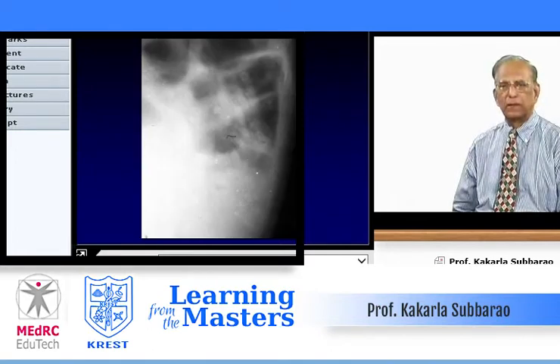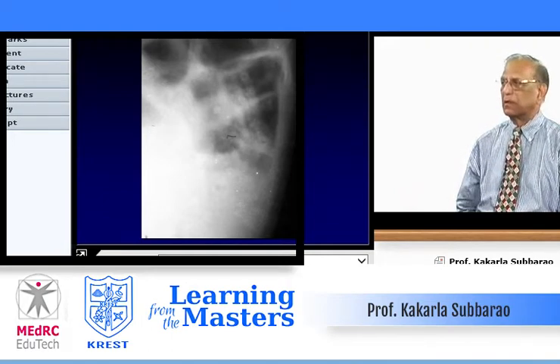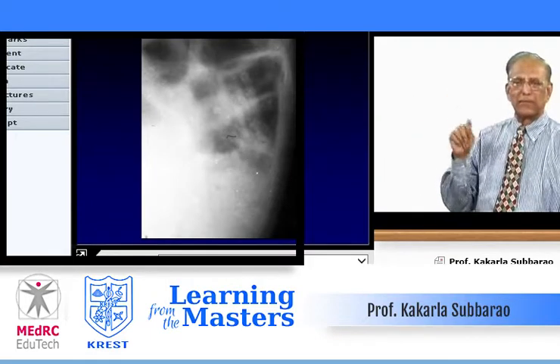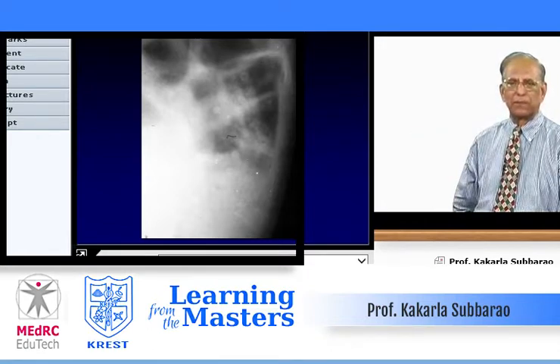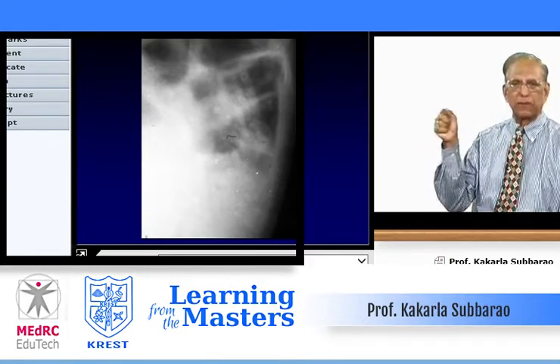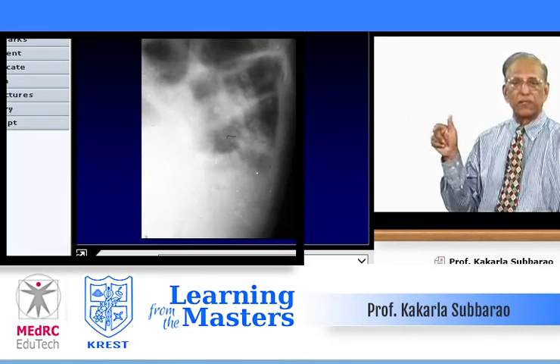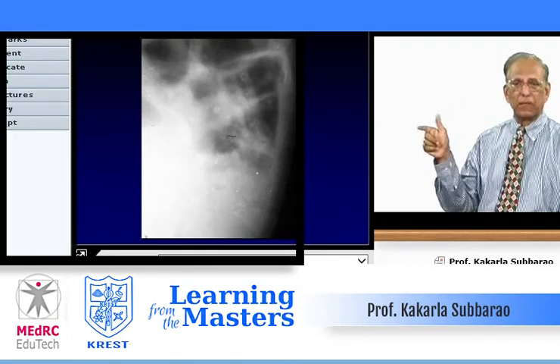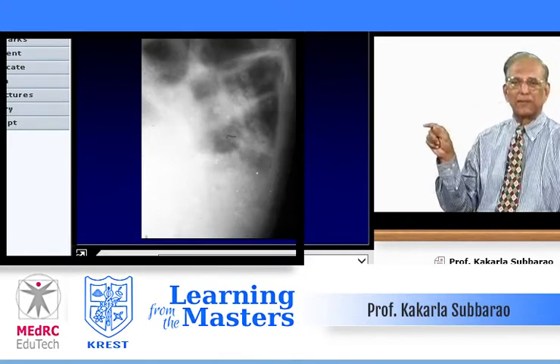This child, about 5 days old, born by natural delivery, had abdominal pain, colic, crying all the time. We took a plain film. There is a rounded calcific density in the right lower quadrant, with multiple curvilinear plaques. This is classical of meconium peritonitis. Thick meconium obstructs the intestine and it ruptures. It must have occurred during the fetal stage, not after delivery, because it takes some time for the meconium and peritonitis to be localized and calcified like this.